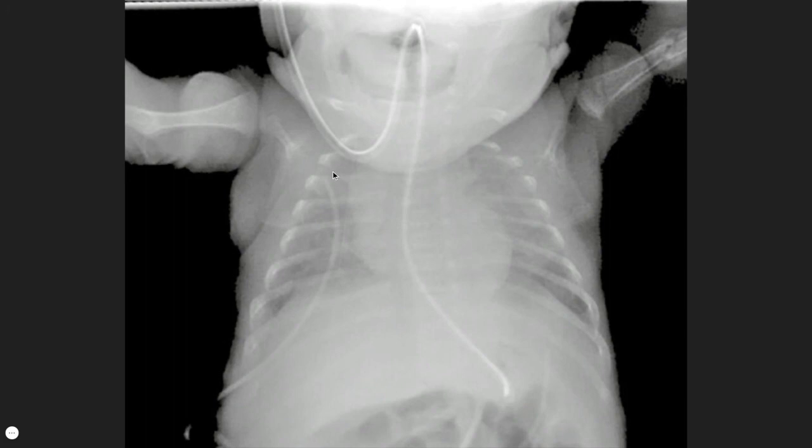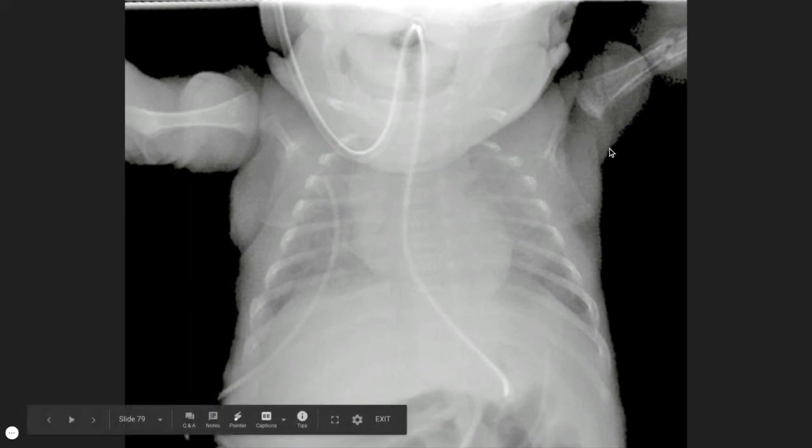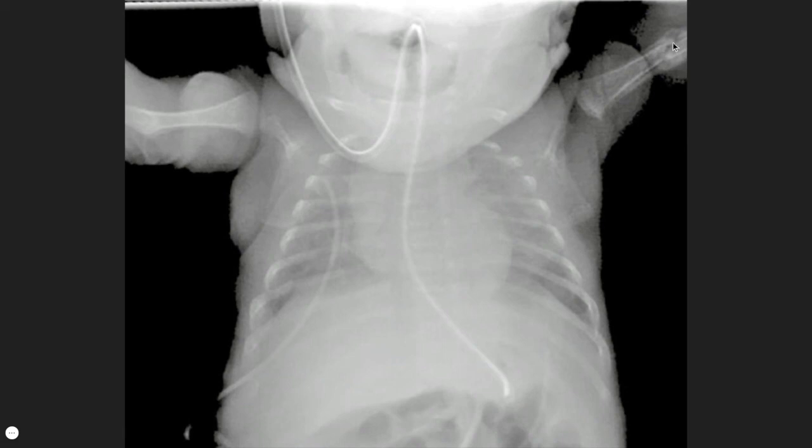We'd finish off checking the rest of our bones and soft tissues, and also our review areas, including behind the heart, hilar, the apices, though this is difficult in this case because of obscuration by the chin, and also the edge of film. And obviously your edge of film check would hopefully reveal this fracture if you hadn't spotted it through your systematic check of the bones.